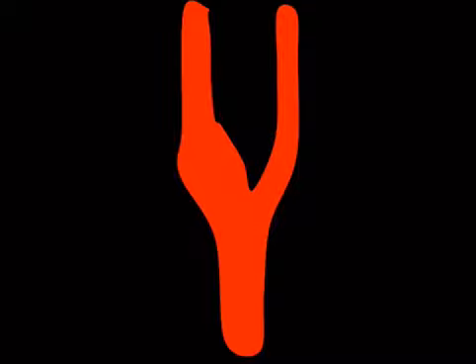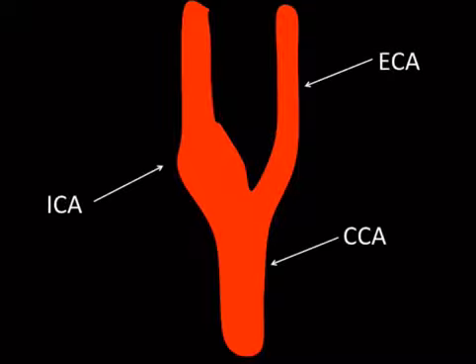So basic idea, and this is just bread and butter carotid Doppler if you haven't done it before. You've got your bifurcation, and readings are done here, here, here, here, here. You can't measure inside the skull. That's pretty difficult. But they do a bunch of different measurements there. And what you're looking at is the velocity of blood, and you'd assume that it would be normal and continuous through the entire area there.